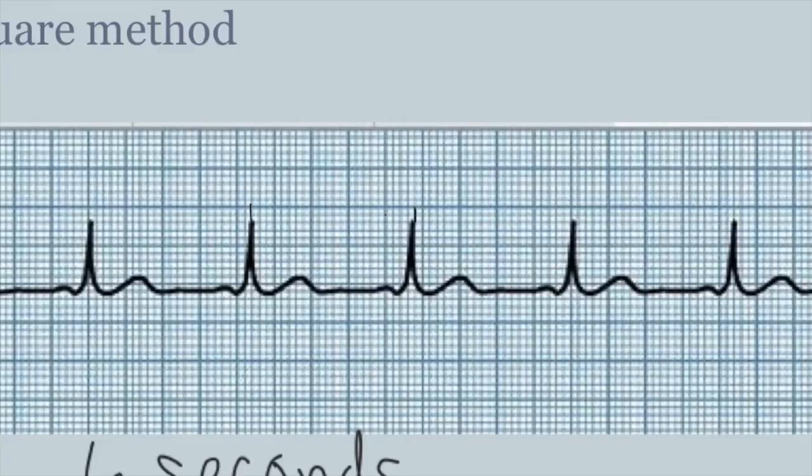So we have 4 squares here, four small squares. We have 5 here, 5 here, 5 here, and 3 here.